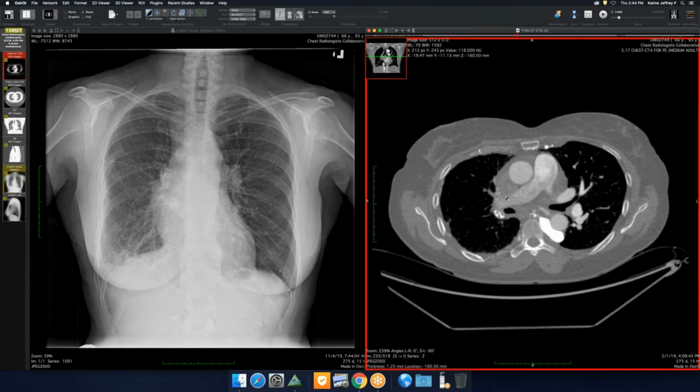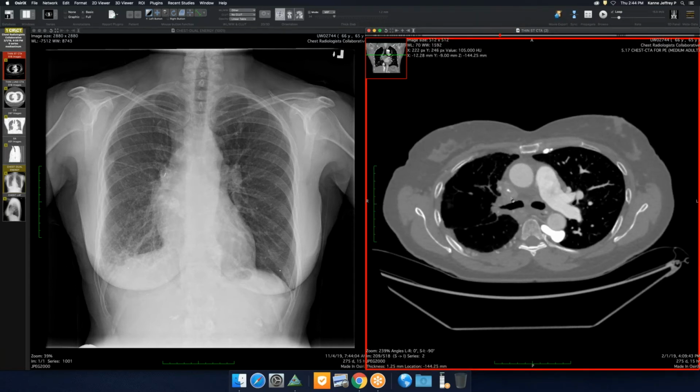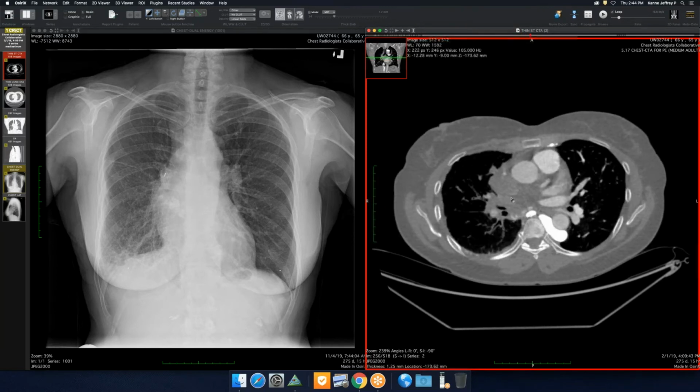And this is presumably some thrombus in the SVC here. Or, I've seen cases where the fibrosing tissue somehow invades, or somehow gets into the SVC and causes just fibrotic tissue there. But then it tends to hang out there.